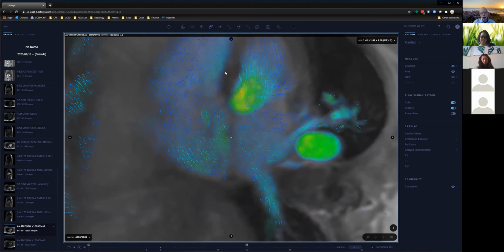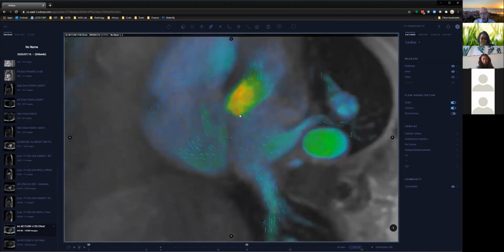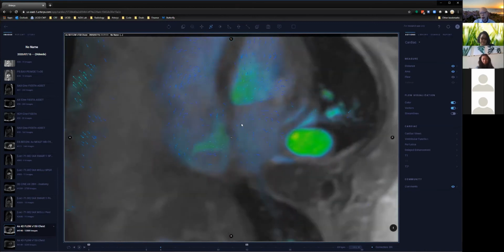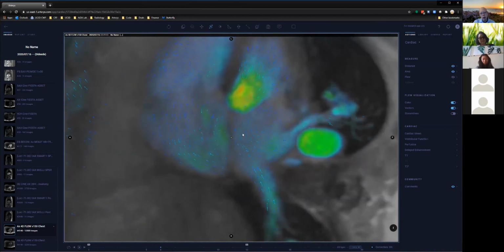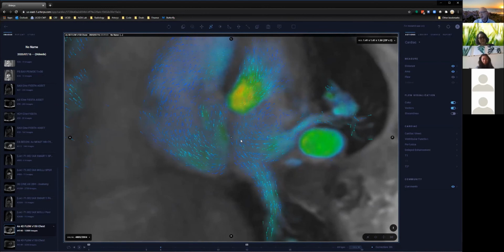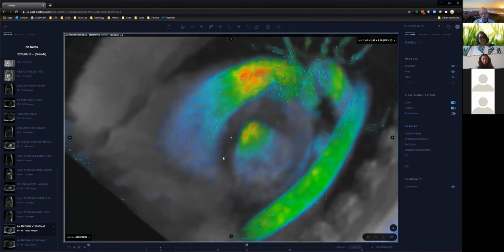Yeah, I'll sweep both in short axis and long axis. Like here, I'm sweeping in long axis. And we try to do that also with conventional MRI. I know a lot of people do both an axial stack and a short axis stack to sort of get that same look. But the problem is SSFP is not flow sensitive. So you always wonder if you're missing it because you can't really see the flow. You can only see the septum, and the septum is going to be really thin. So I really struggle with that with conventional imaging.